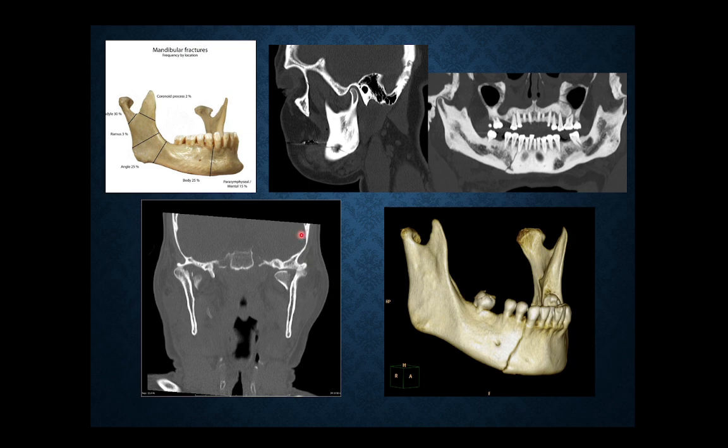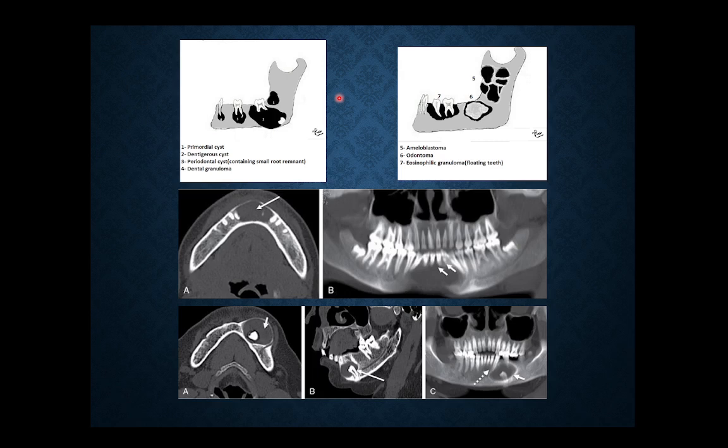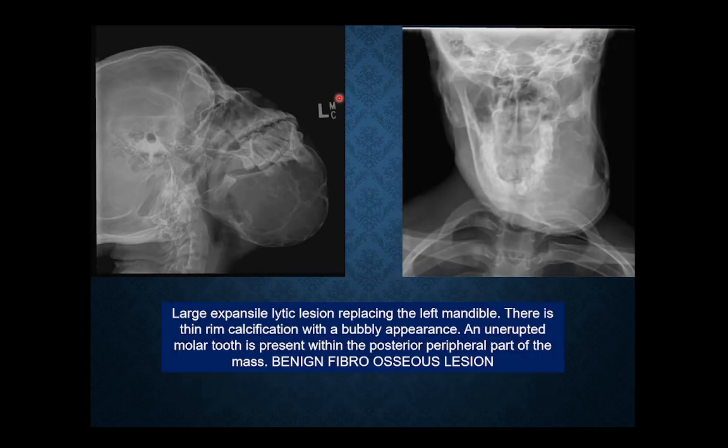Okay, so now here you can see one important point. This is the temporomandibular joint. For the assessment of TM joints, we can have open and closed mouth X-rays, even MRI for the assessment of the articular disc. So in open mouth position, this condyle moves anteriorly up to the anterior margin here, but in closed mouth it should come inside the joint. If it does not, this is TM joint dislocation.